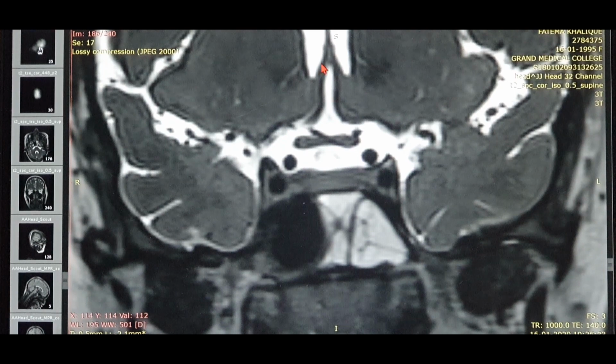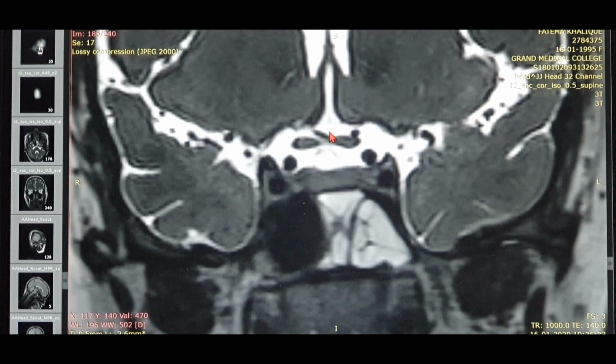As you can see, it is a post contrast or it is a T2. Now this scan is a T2 scan. Still the vessels are not appearing as illuminant because it is not a contrast scan. Because of the high blood flow velocity, you cannot see the illumination in the vessels. So this is the internal carotid artery in the cavernous part. You can see now why do you see these two holes as two black voids?